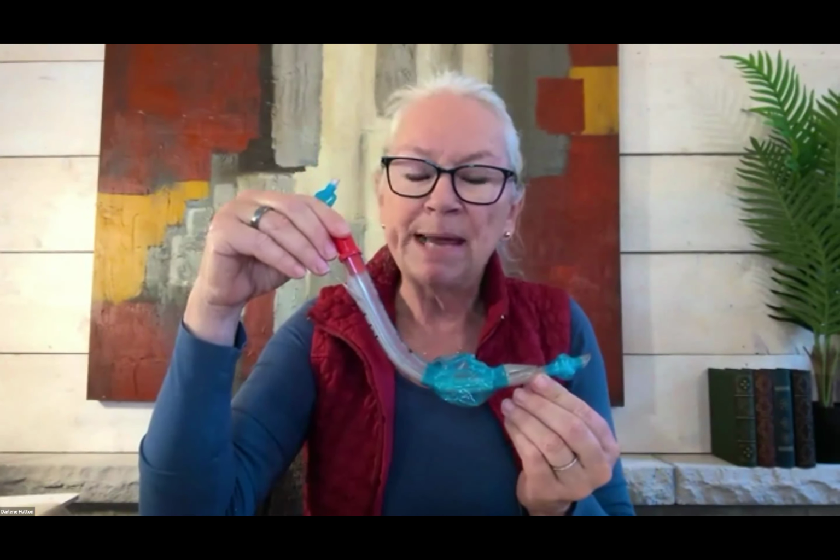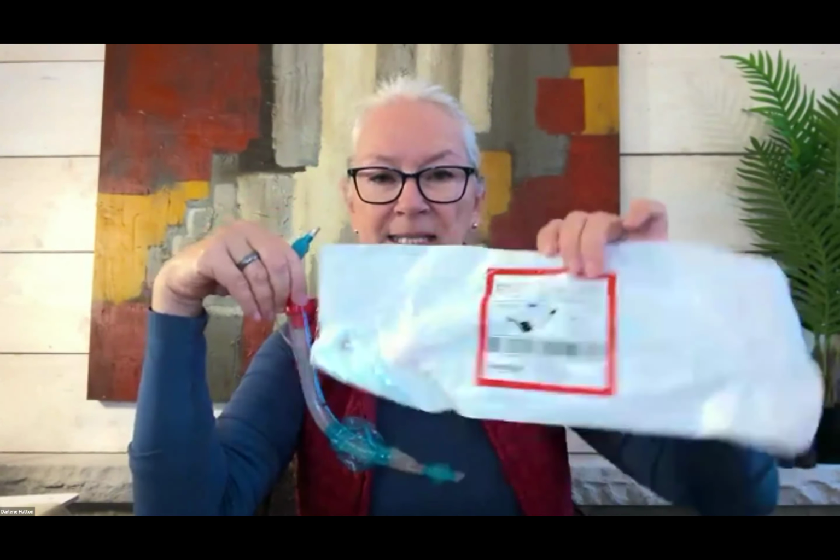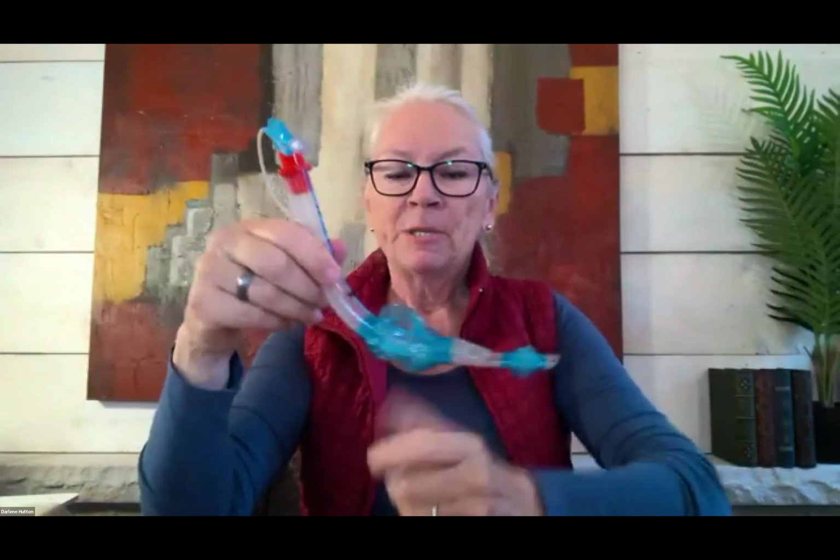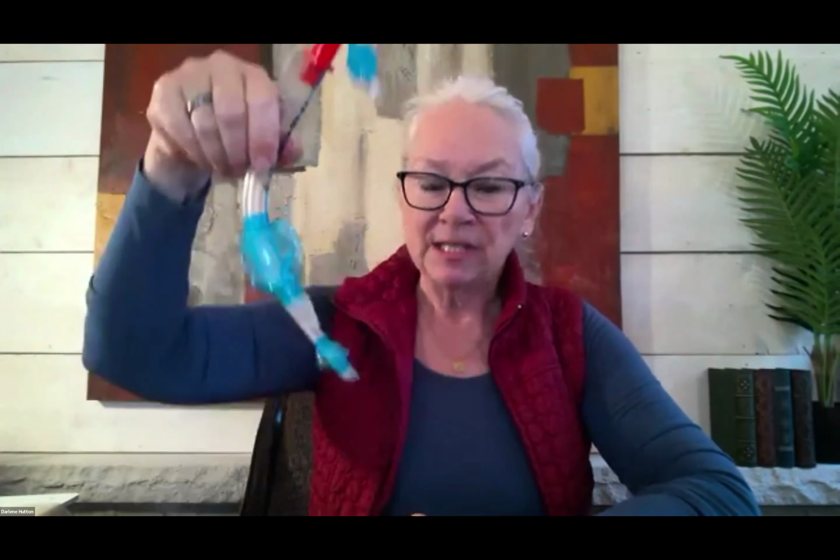The next advanced airway, which is also supraglottic, is called the King LT, kind of a second generation. The first generation LTs had some inherent flaws. These ones are actually really nice. They are sized based on the patient's height. So for example, this size here, it says 5 to 6 feet, okay? So again, it's a blind intubation in that you just insert it in, and just the way the trachea and the esophagus are situated, it will go into the entrance of the esophagus.